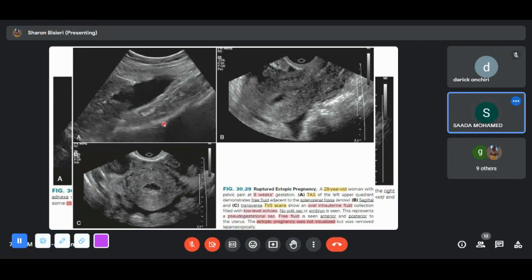A patient with low abdominal pains, with free fluid in the endometrium, negative pregnancy test, what would be your differential? They can come with acute abdomen with fluid in the endometrium. It will be infection, isn't it? Endometritis, acute endometritis. Yes. So it's always good to get a history, so that if she's spotting and that sort of thing, it increases your confidence level.